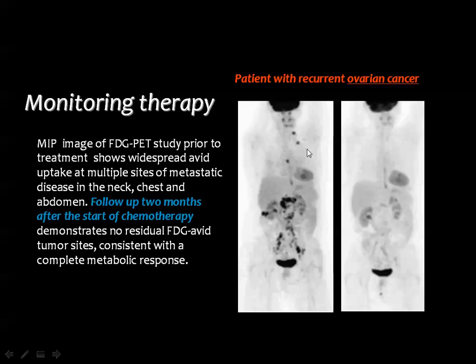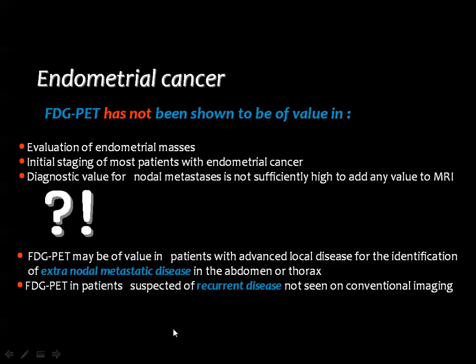And this is an example of a PET scan of a case of recurrent ovarian cancer, and this is the follow-up 2 months after therapy, and you can see the good response to treatment.